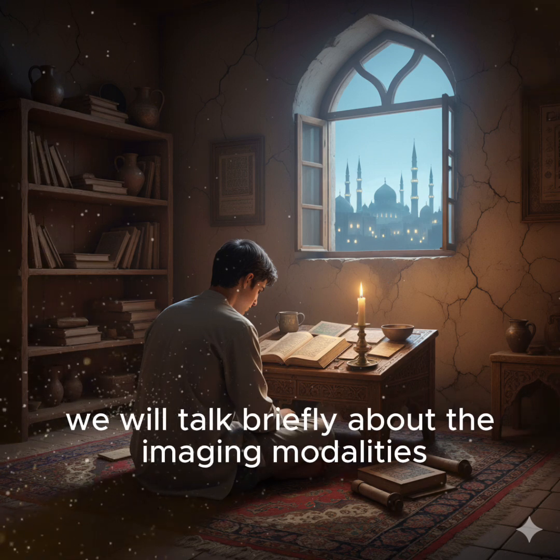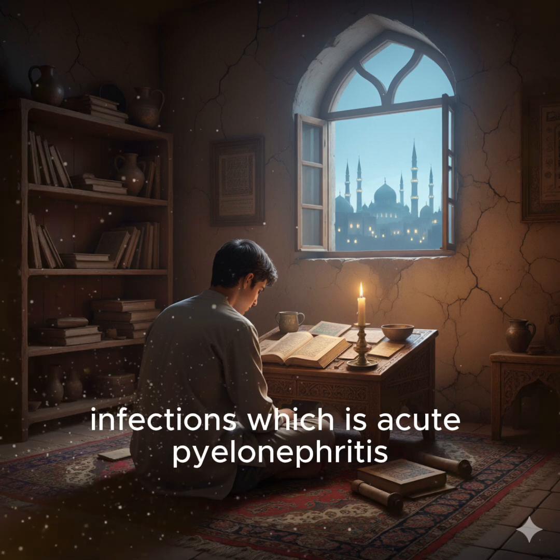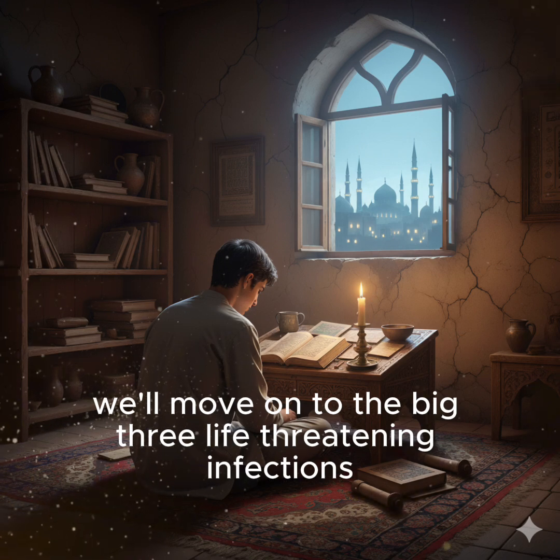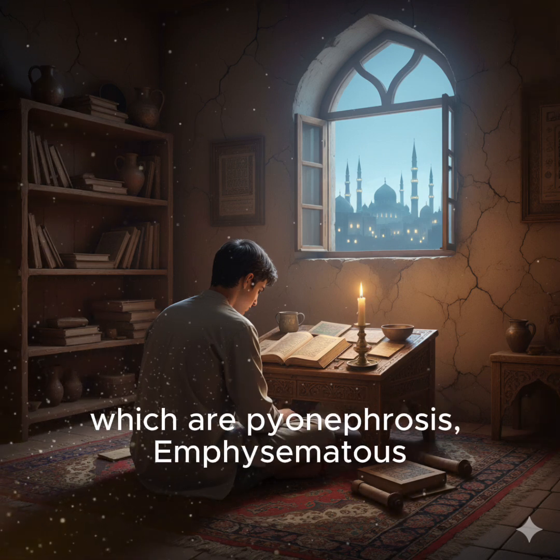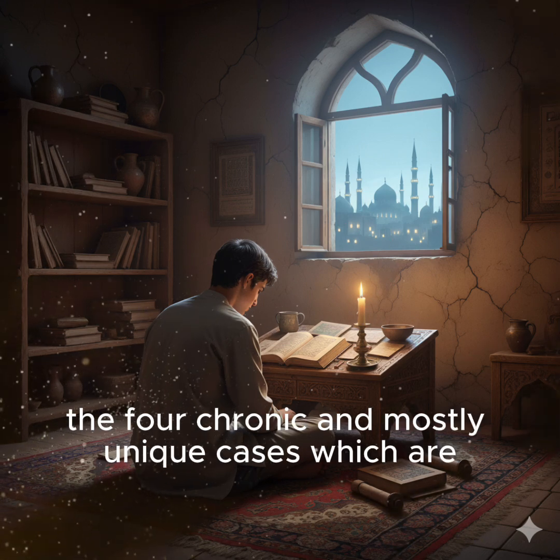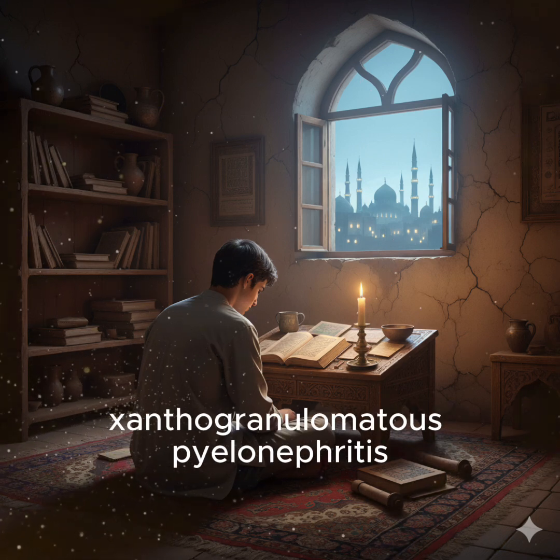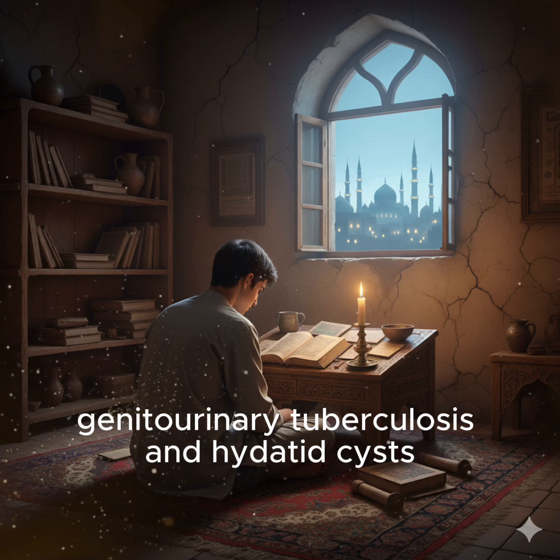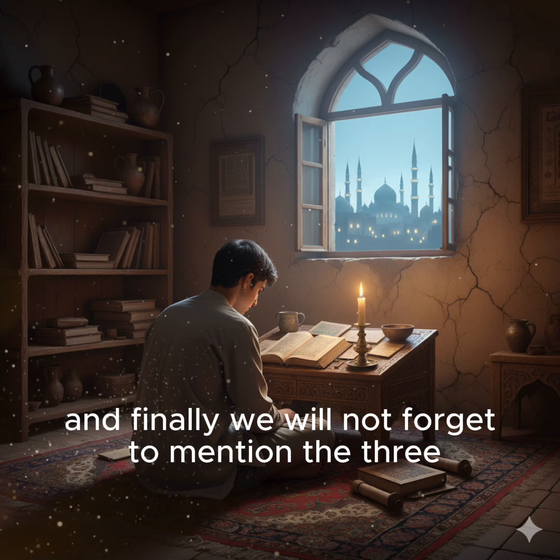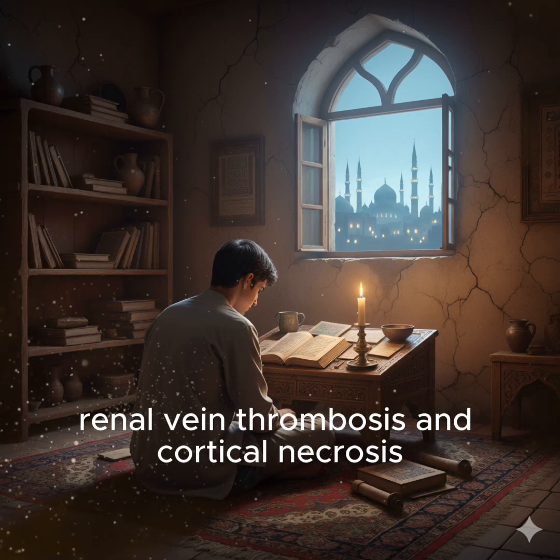We will talk briefly about the imaging modalities, and then we will describe the gold standard of renal infections, which is acute pyelonephritis. We'll move on to the big three life-threatening infections, which are pyonephrosis, emphysematous pyelonephritis, and renal abscess. Then we will list the four chronic and mostly unique cases, which are chronic pyelonephritis, xanthogranulomatous pyelonephritis, genitourinary tuberculosis, and hydatid cysts. And finally, we will not forget to mention the three critical non-infectious mimics, which are renal infarct, renal vein thrombosis, and cortical necrosis.